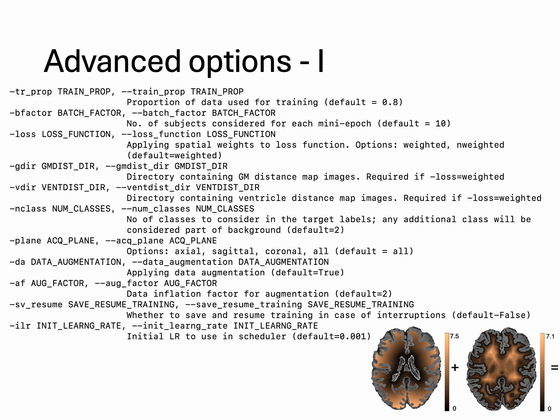Okay, the advantage with this is that if your job is interrupted in the middle due to power outages or quota exceeding and all those things, the model will be saved, and when you resume your job again, it will not train from the beginning, but rather from where it stopped. So it is essentially good in a shared resource environment where your job is constrained by some queue or some running time and all those things.